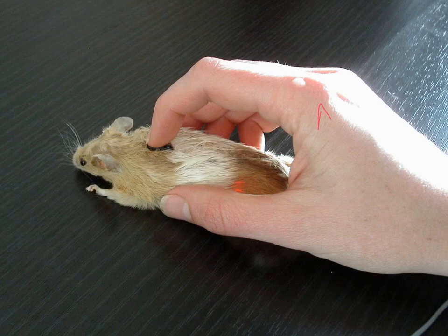Depending on your system, moving it forwards and backwards might change the window, and moving it from side to side may change the level. That may flip on the different systems, but effectively what we do as radiologists is we push the button and we wiggle it around till the image looks okay.